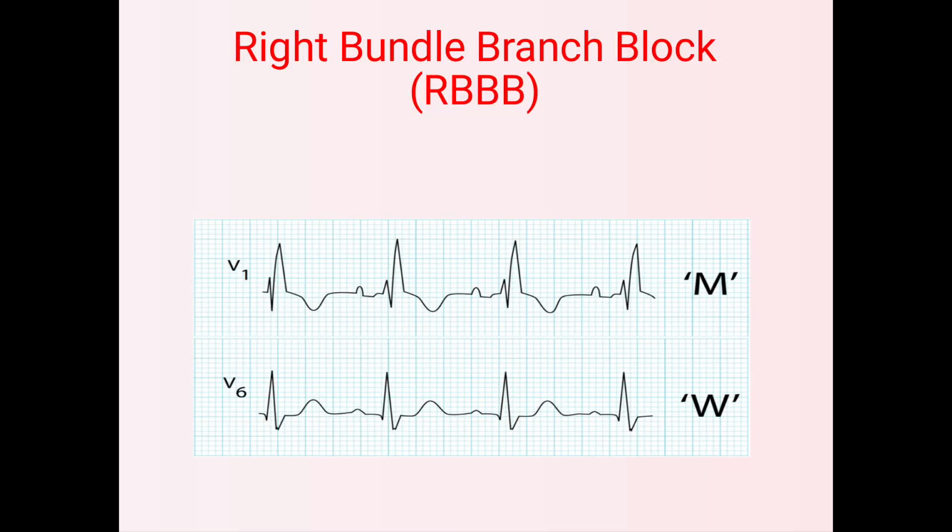Hi friends, in today's ECG basics video, I will talk about right bundle branch block.